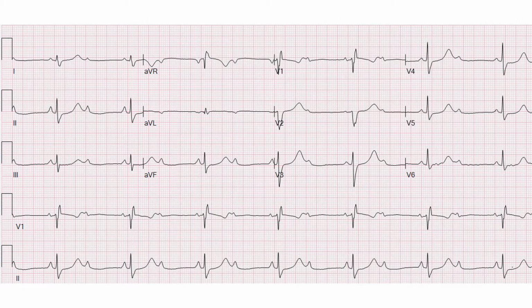Looking at this EKG, the most likely diagnosis is: 1. Complete heart block, 2. Mobitz type 1 heart block, 3. Wenckebach heart block, 4. Third degree heart block, and 5. 2:1 second degree heart block.